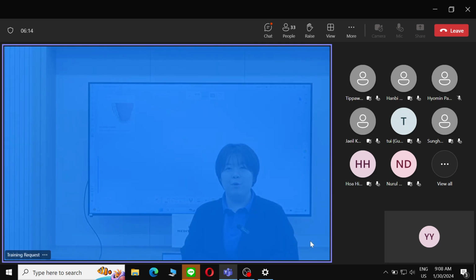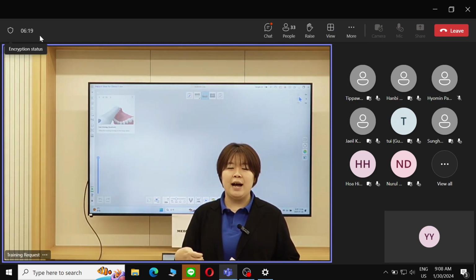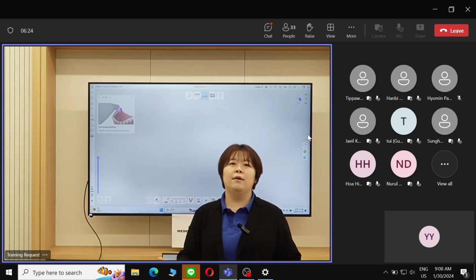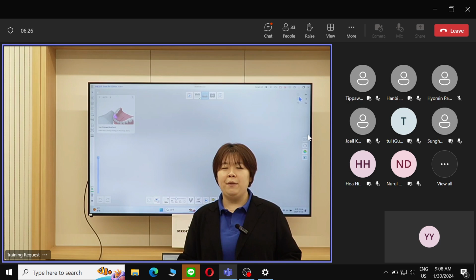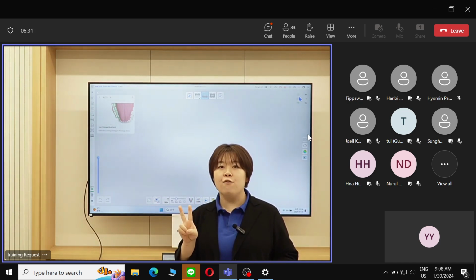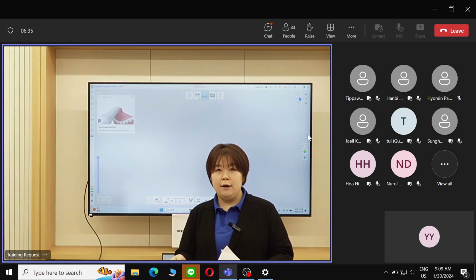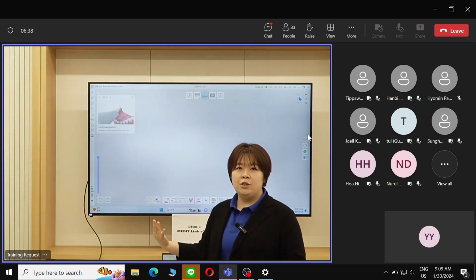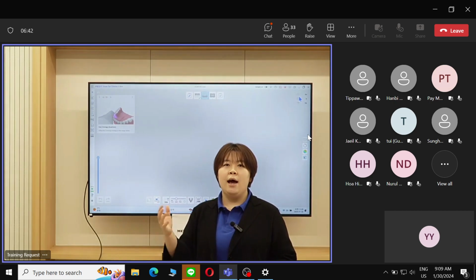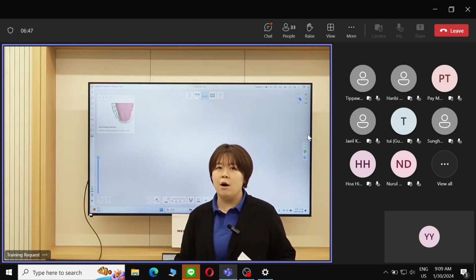Also, if you've been with us for long enough, maybe some of you were with us when we were launching the i700 intraoral scanner. During the launching event, we mentioned that we were able to achieve a 2 times faster scanning performance with the new scanner. So today, with the demonstration that we're going to do with the new MEDIT Link version, you will be able to witness once again how we're getting a much better scanning performance with just the software upgrades.